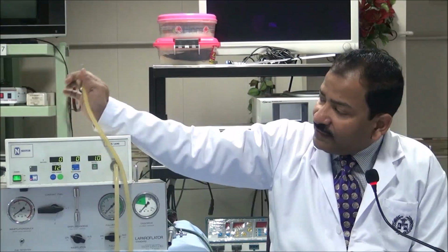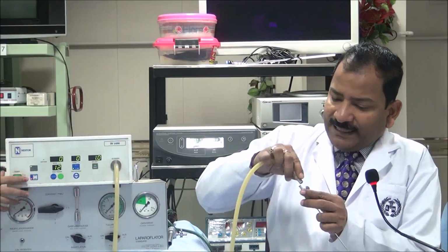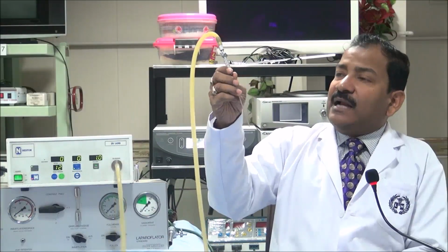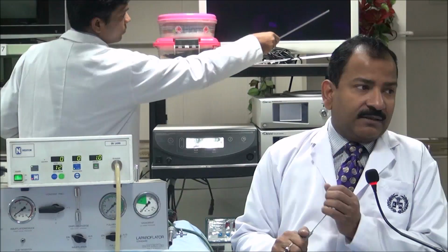Some people, once they put the Veress needle, don't immediately start the flow. First your insufflator is switched on. Then they put the Veress needle, and then they attach the tubing, or they keep the tubing attached to the Veress needle, so that inside there is a negative pressure.